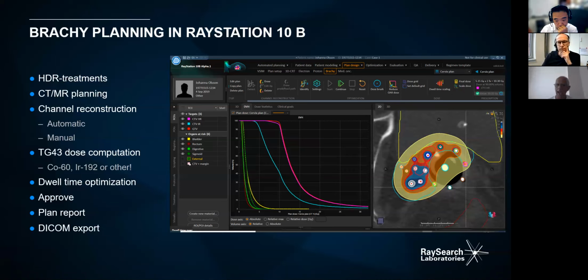We don't account for that. It's of course not that easy to deform accurately. What you can do is transform your dose into EQD2 if you like. Then you create the deformable registration, deform that dose onto the other, and just sum them. Whether that's a good enough model or not, I'm not the right person to answer.